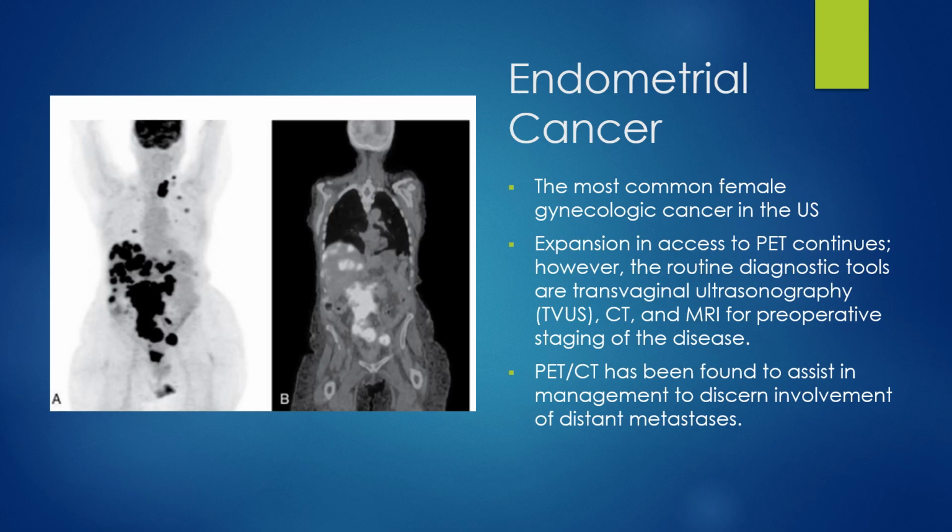This is endometrial cancer. The patient here on the left is a patient with endometrial carcinoma. The FDG study is seen on the left, and then B is the CT. It shows active tumor progression involving the uterus and then progressing through the abdominal cavity, in the liver, up here in the supraclavicular area, some in the chest. It's hard to see without having other views or slices if that is lymph node or in the lungs or where that has metastasized to. But FDG lymphadenopathy within the neck, abdomen, pelvis is present, and there's also liver, lung, and bone mets.